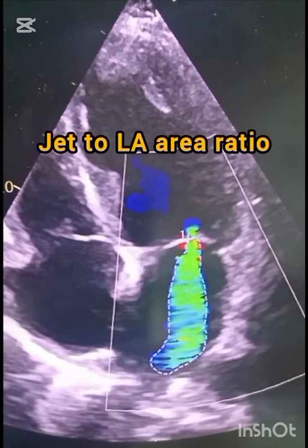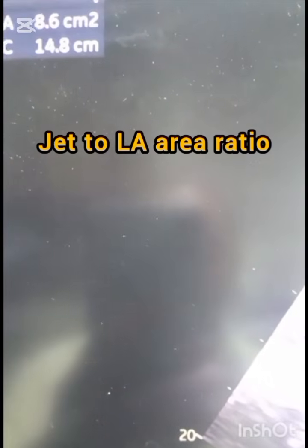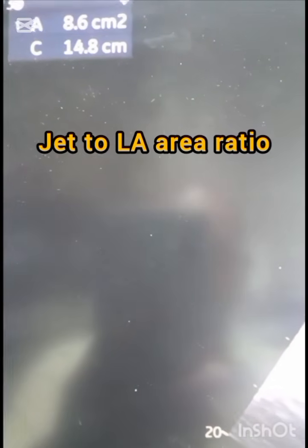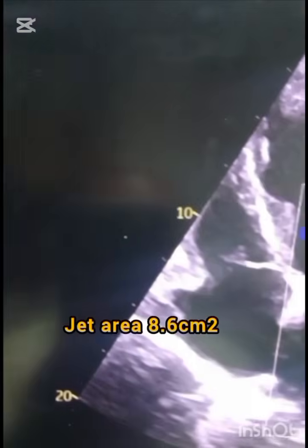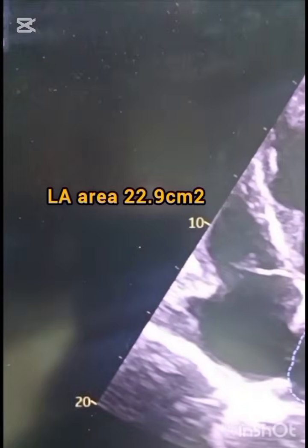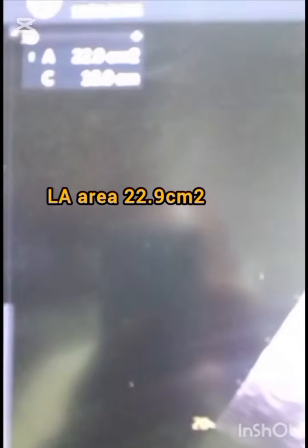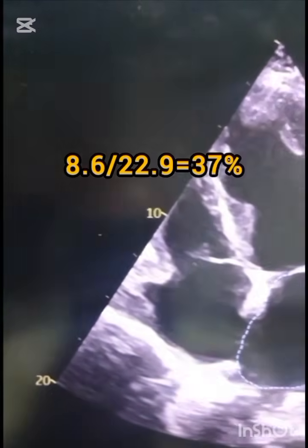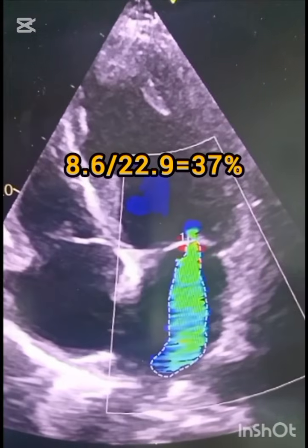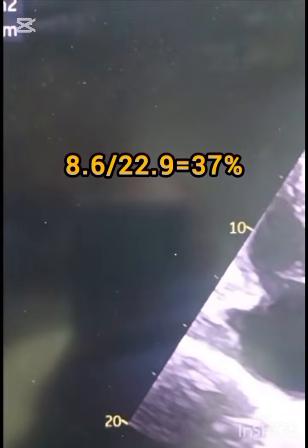Look at this. This is the jet to LA area ratio method. In this method, we trace the jet area, which is 8.6 square centimeters. Then we trace the LA area, which is 22.9 square centimeters, and then we divide the jet area by the LA area, and this will give us the percentage.